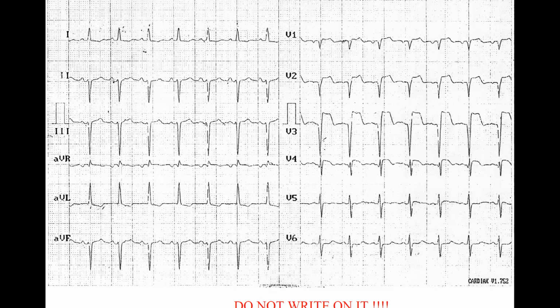Okay, now we have an extreme left deviation. What could be the cause of an extreme left deviation? What was the first ECG that we looked at today?